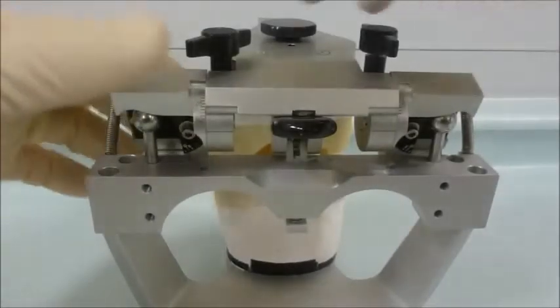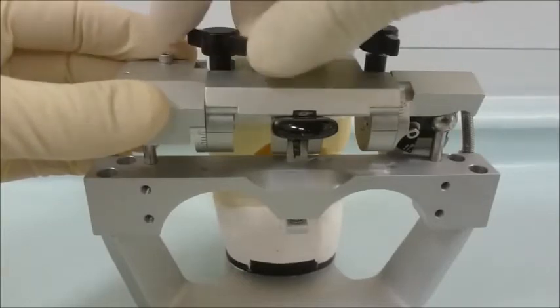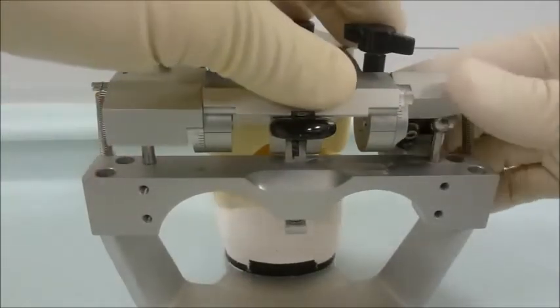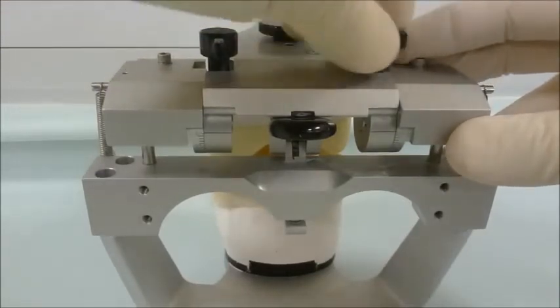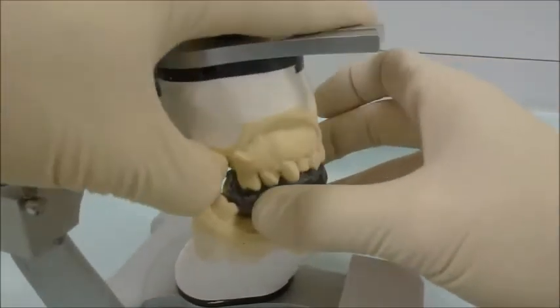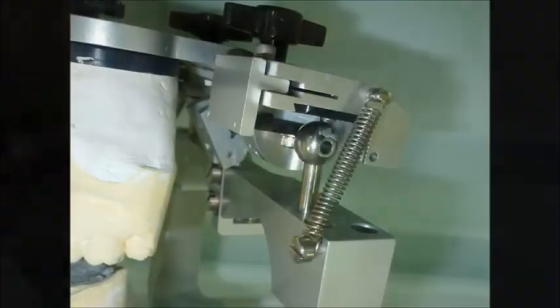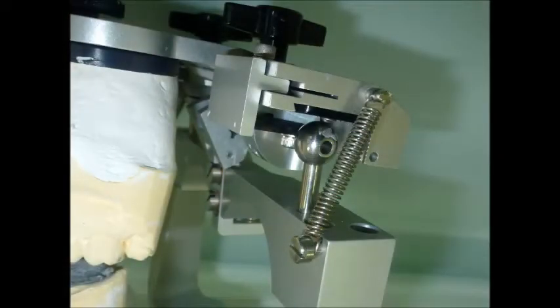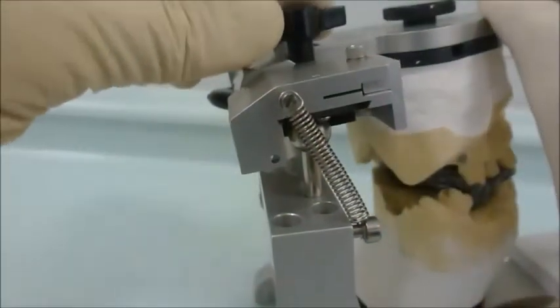To program the condylar guidance angle, a protrusive intraocclusal record is required. Using the scale on the back of the articulator, the condylar guidance angle on each side is set to 0, and the screws are tightened. The intraocclusal protrusive record is introduced onto the lower cast and the upper cast closed into it. As we would expect in this protruded position, the condyles are now standing away from the superior wall of the fossa on both sides.